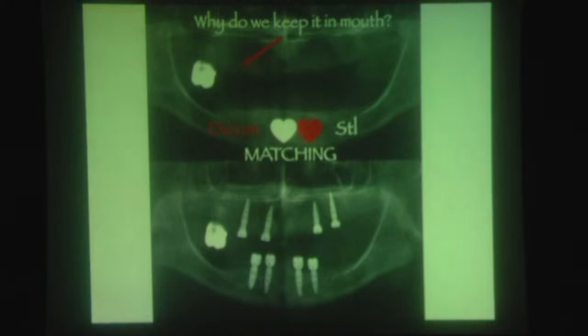So, DICOM and STL, wedding ceremony, matching, and after it, everything is okay. With this natural, immobile tooth, we can have the reference, and we can make the DICOM and STL files match so easily.